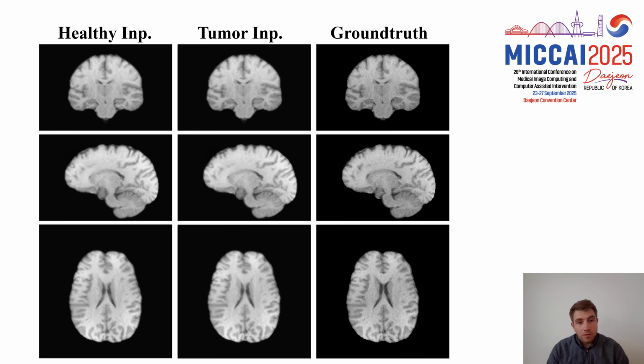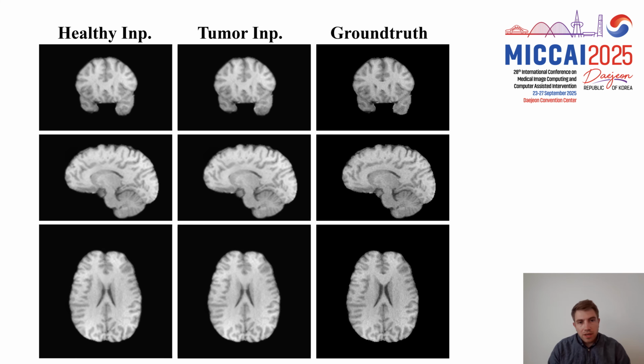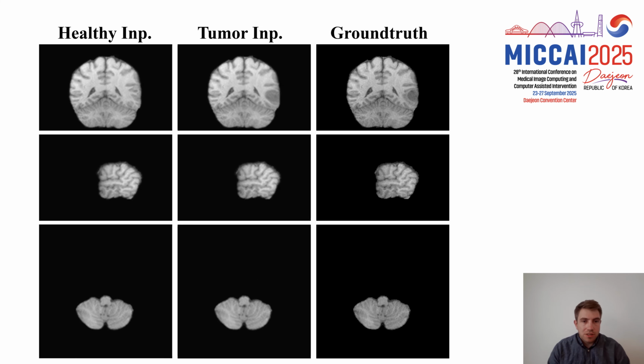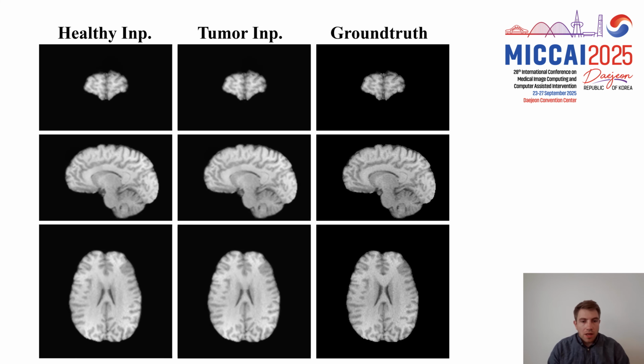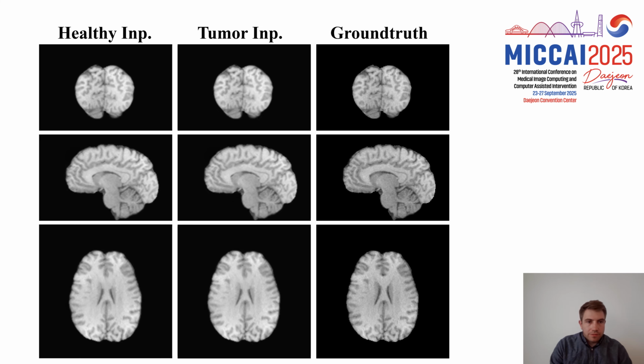And finally, if you scroll through the different axes, you see that the reconstruction is very consistent in all directions, and we also see quite some nice results here, I would say.